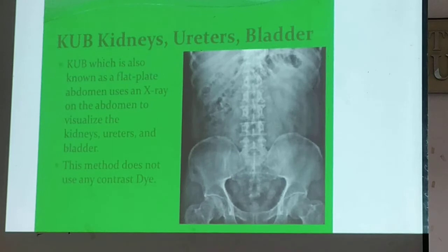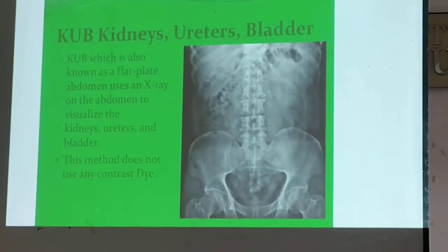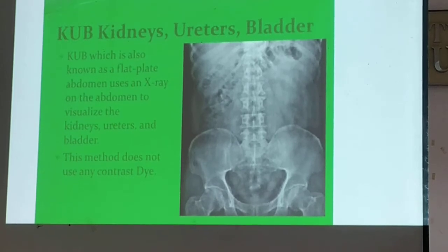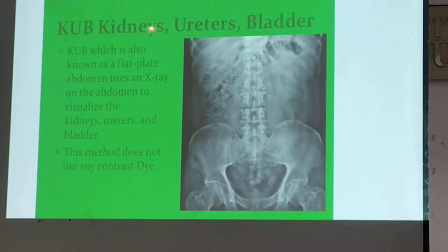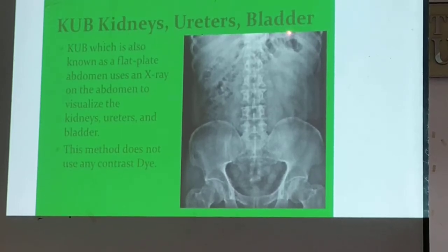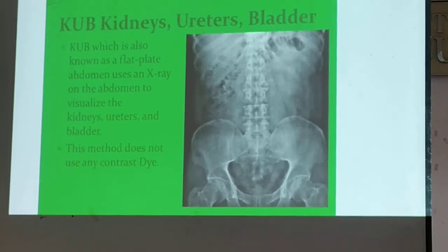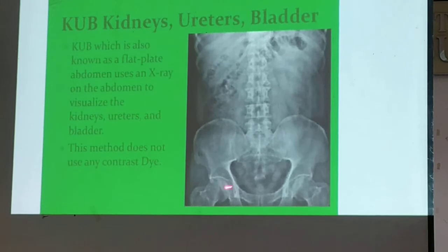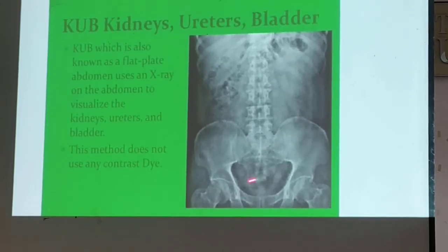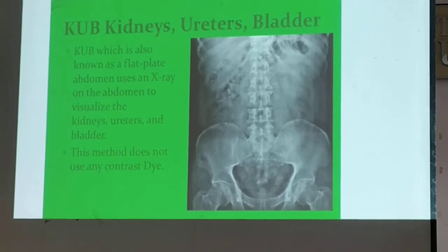So those who answered both abdominal X-ray, I consider that. Because you're right, both are abdominal X-ray. The only difference is that in KUB, the diaphragm usually is not visualized. In flat plate of the abdomen, both diaphragms should be appreciated, and there is a cut off here on the pelvis with flat plate of the abdomen.